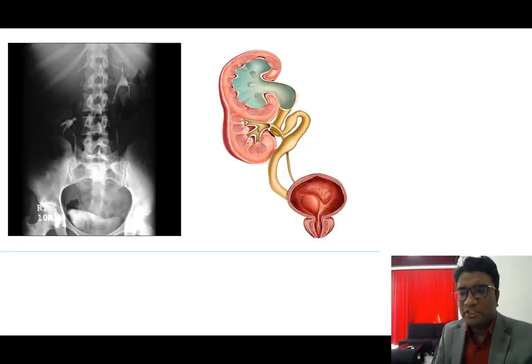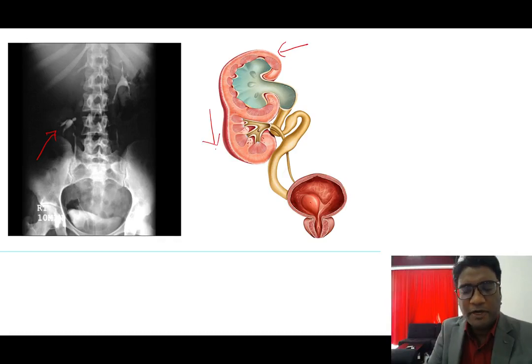Let me show you an image. Look at here. The upper, superior kidney is hydronephrotic, non-functional. Even though it is a duplex kidney, I only see one pelvic calcial system because the upper moiety is non-functional. It is compressing the lower moiety downward. So this is a duplex kidney with non-functional upper moiety. And this is what is called your drooping lily sign.